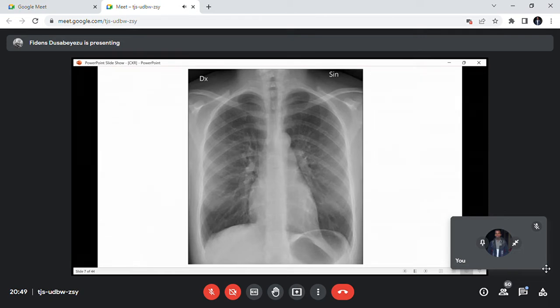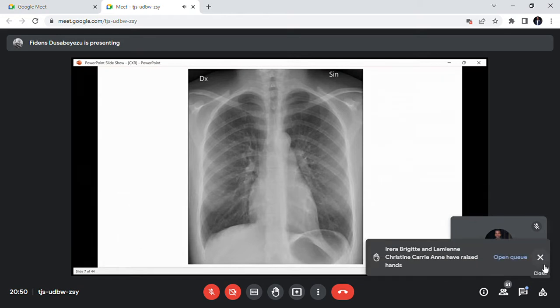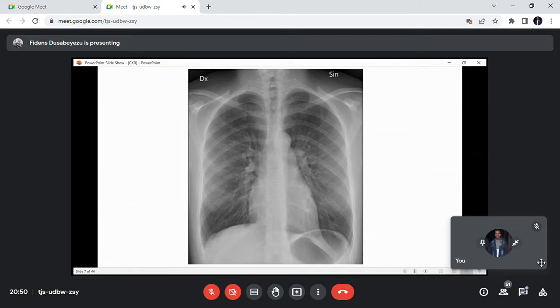Because if the patient breathes the air out of the lungs, where there is that obstruction, that foreign body in the bronchus, that air will not come out. And behind it now it's dark compared to other parts of the lungs. That is called air trapping on the chest radiograph. Okay? Or in asthma, or when you are suspecting a mild or small pneumothorax. If you suspect a small pneumothorax and you do a deep, yes.